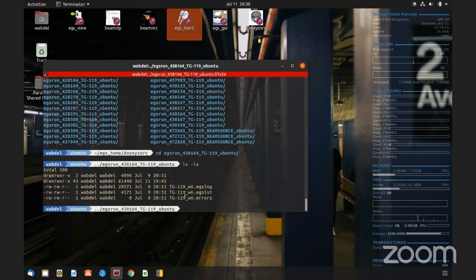That's my input file, and this W6 is the splitting, the file number 6. There should have been more files here, or maybe they were stored in the original directory. I'm really not sure, but you need to go into these folders and take out the relevant files, and then you can resume.